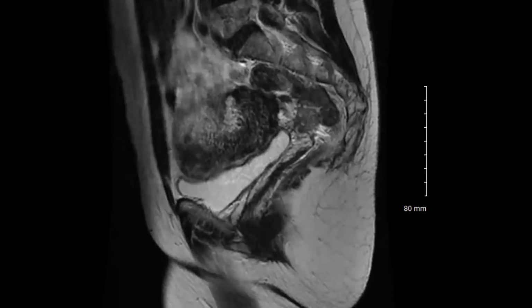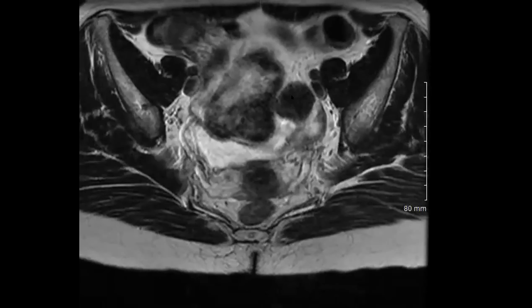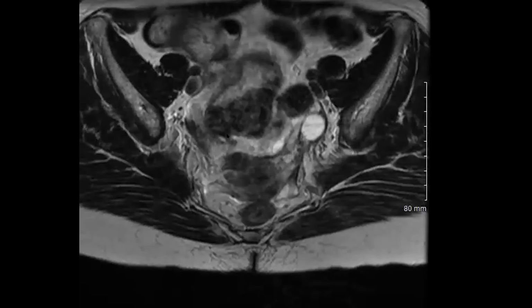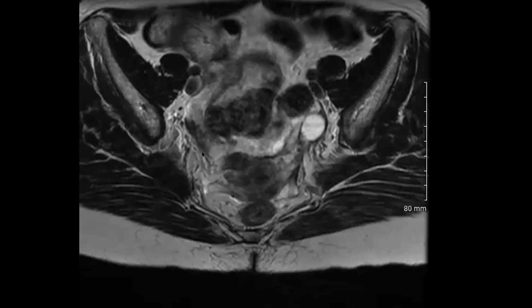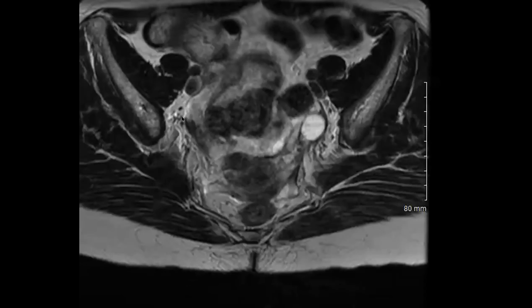Okay. Sure. It's fine. If you had more questions, I'm happy to scroll through. Like here on the right side, I like this T2 dark stuff, right? Is that part of the bowel? No, the bowel's right here. Yeah. And there's this dark stuff here too. I didn't see it communicating with the bowel. No, that's serosal surface. That's outside.